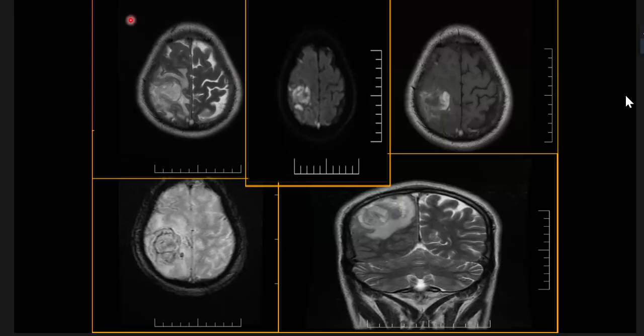So what do you think of hemorrhagic lesions, brain hemorrhagic lesions? Hemorrhagic metastasis. Very good. Less likely infarct. Why are you feeling infarct? It could be an infarct with hemorrhage, or it could be just hemorrhage also. Can hemorrhage show restricted diffusion? More of blooming I feel, sir, rather than that.